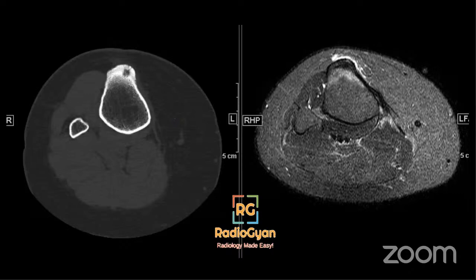A differential in that case would be osteomyelitis or osteoblastomas, but osteoblastomas usually are larger than 1.5 to 2 centimeters. So they're not usually an issue with differentials. And the other differential is Brodie's abscess. That can often mimic an osteoid osteoma, but on bone scan, that'll show a central area of reduced uptake due to avascular purulent material as compared to osteoid osteoma, which will have more of a bright uptake.